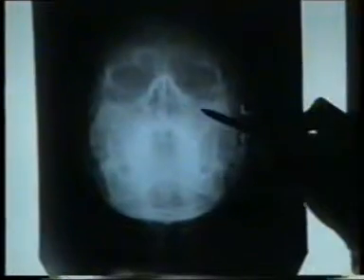Similarly, in the next X-ray plate, we see on the left side an air fluid level with concavity pointing upwards, so this indicates left maxillary sinusitis with a fluid level. The third plate, again a Waters view, shows complete haziness of both the maxillary sinuses. Here the haziness is much more as compared to the orbit. So the orbit acts as a guideline or as a reference to the pathology of the maxillary sinuses, and here the walls of the maxillary sinus being intact indicate that this is chronic maxillary sinusitis.